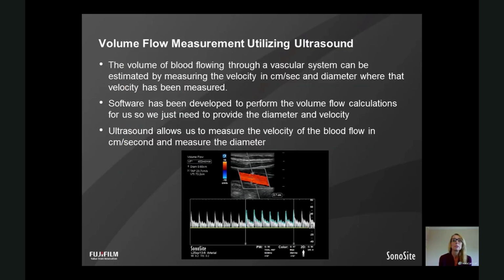So, volume flow measurement utilising ultrasound. We know that there are a few different ways to do volume flow measurements. In dialysis, in most units we're familiar with a couple of them. Dilutional measurements, where we'll either use an ultrasound and saline as our dilutant, or we'll use warmed dialysate as our dilutant to measure the volume flow. We can only do that on dialysis. So another way that we can do it is to measure it utilising ultrasound.